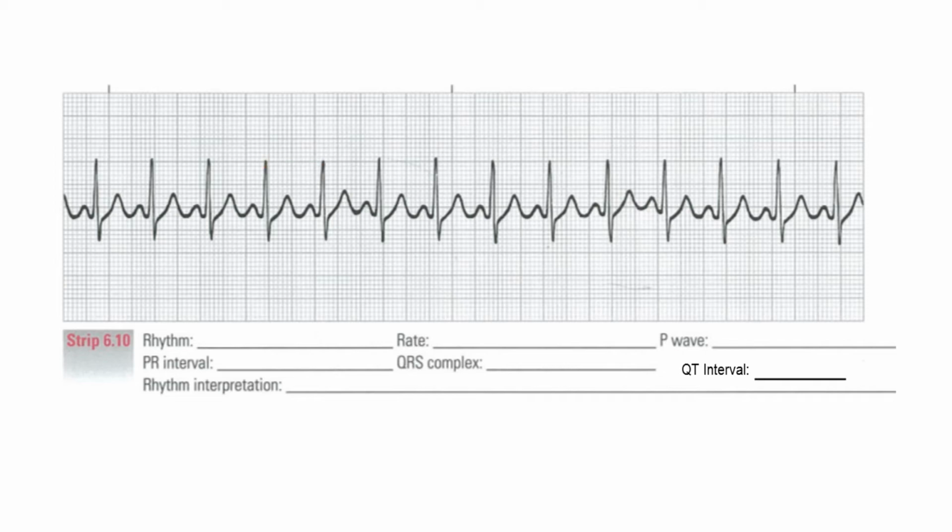And again, we are requiring you to convert that heart rate, if it's a regular rhythm, using the small box conversion table, and you will get that on your test.